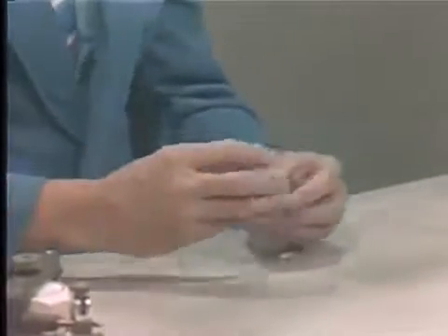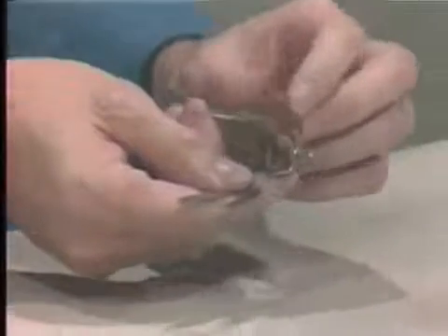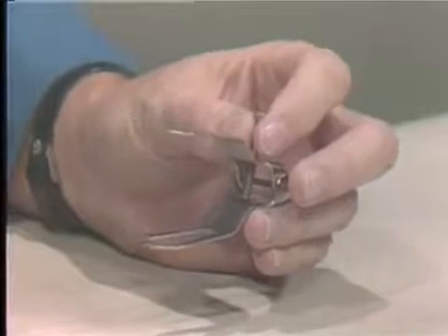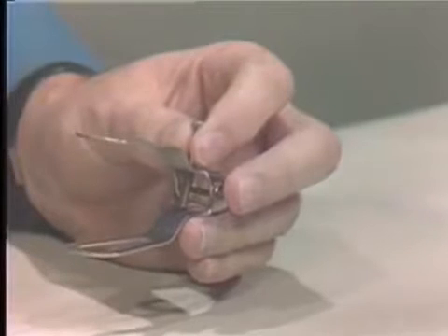This is a simple hinge articulator, sometimes referred to as a barn door hinge. It has only one movement, that's up and down or open and shut. There's no way that you can compensate for a lateral movement. It's used usually for a unilateral mounting, where you just mount part of the arch.